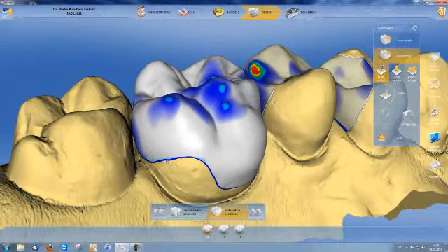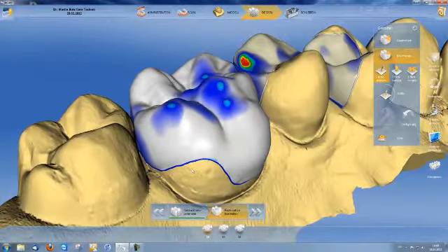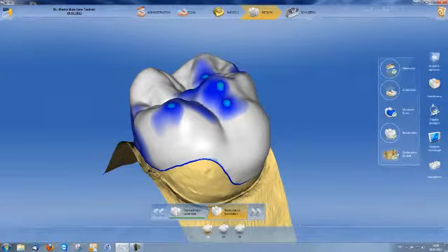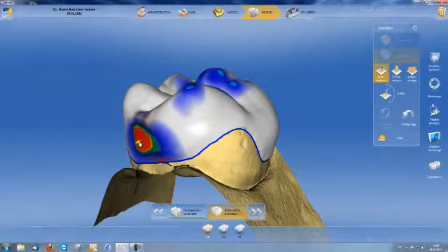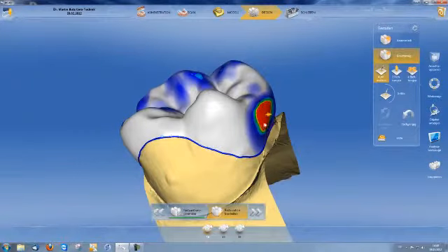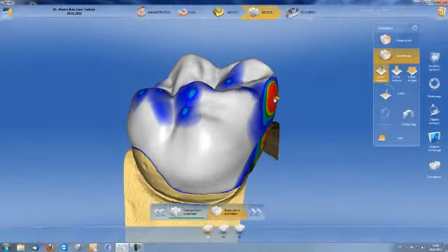It is clear to see here that the minimum wall thickness has been undercut, i.e., material needs to be built up slightly here. I then go to Display Objects and Trim. You can see a slight proximal contact here. This is built up to become stronger and flatter. Large area for building up, and here is a small area for adjusting how strong the proximal contact is to be. The same is done mesially. Adjust the proximal contacts slightly.